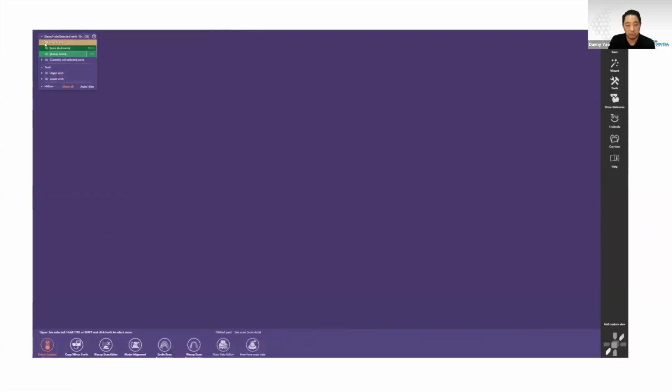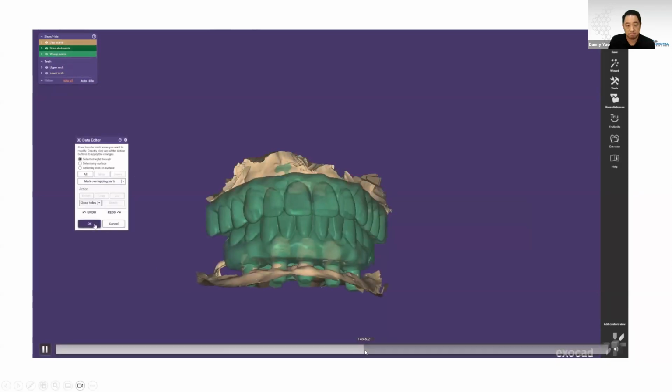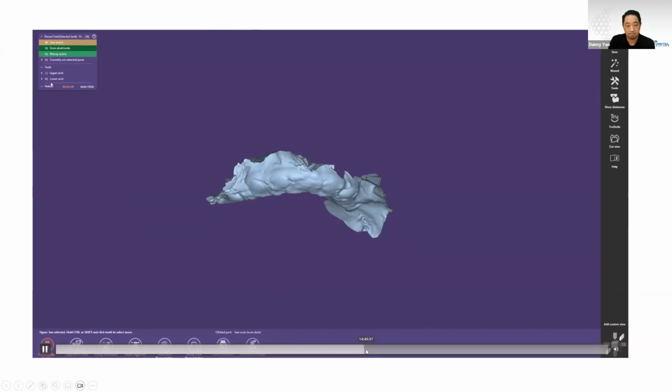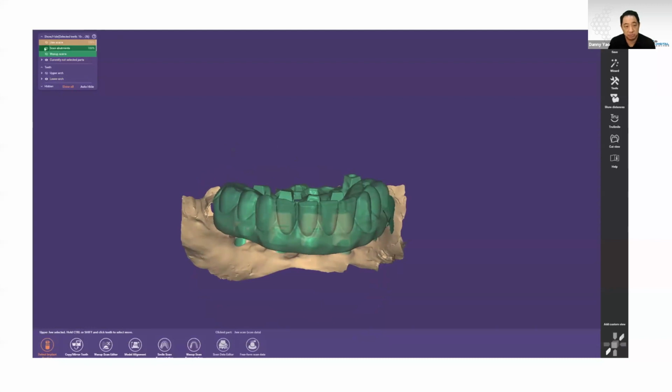Skipping ahead a little bit here. You guys can see us do the lower.